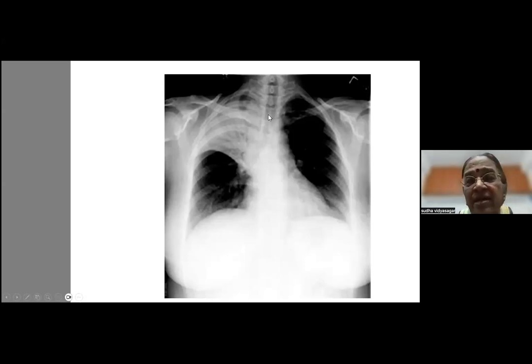And the trachea has not shifted. Why are we calling it something else, saying that there's a collapse? Where is the trachea? Of course, this is the minor fissure. Correct. That looks a little pulled up. I agree with you, but it's nicely respecting lobar boundaries. This shadow is not crossing lobar boundaries. So it's sticking to a lobe. That is more in favor of a consolidation.